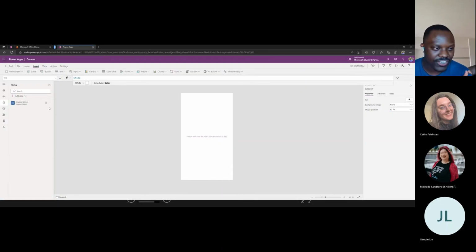So at this point, I should have been asked to get my key, but it doesn't ask me to do that. And I do not know how to get it to ask me to do that. So I was not able to connect. But what I'll do, I'll just demonstrate how we built a layout.